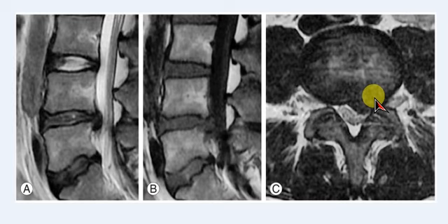And it is important to understand that the MRI image is a reversed image. So this is the right side and this is the left side. So this is the left side that is being compressed. So you can see this is the thecal sac containing the spinal cord. Normally it would have been like a triangle over here, but because there is compression, you can see this black portion is compressing this region. Otherwise this would be white all the way. This is very important for us to understand and remember.